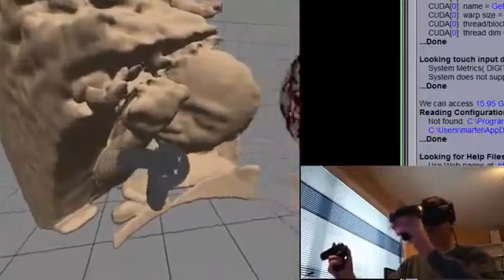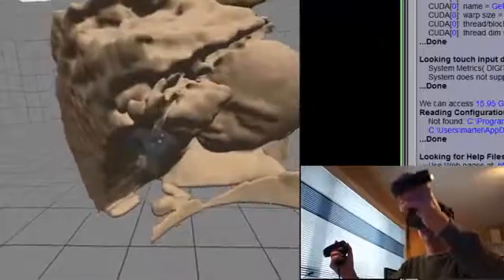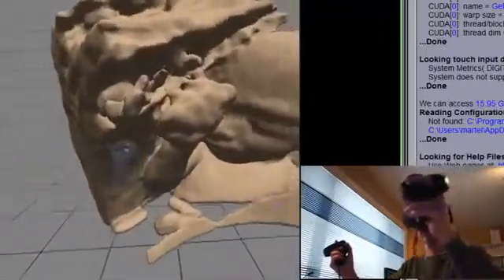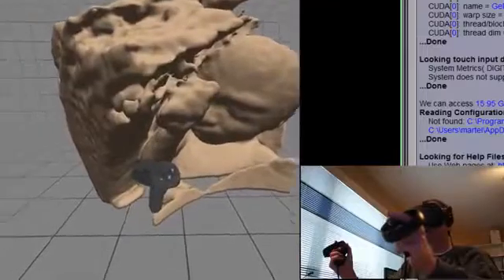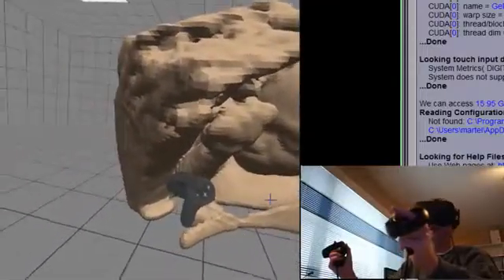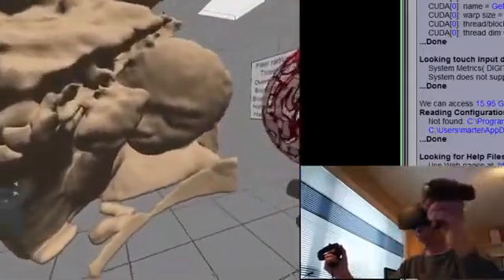And the left hand tool is used to move my geometry. If I use my trigger, then I lock and I can move my geometry. I can also change the scaling with the control on the top of the interface, or change the resolution of my model if you cannot achieve real time. But I've got a big graphic card, so it shouldn't be a problem.